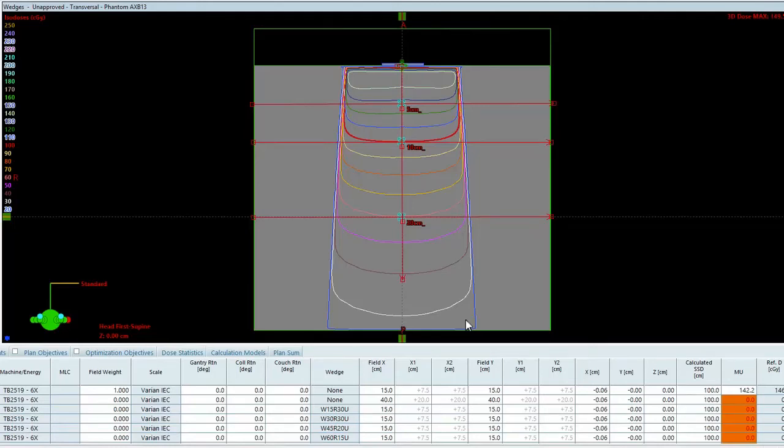This video is going to take us through hard wedges, wedge factors, and wedge profiles, and I'm going to use the treatment planning system to illustrate this. On the screen, I have set up a 40 by 40 by 40 water phantom, which is this light gray color, and then I have a series of red lines. The vertical red line here is going to be the central axis.